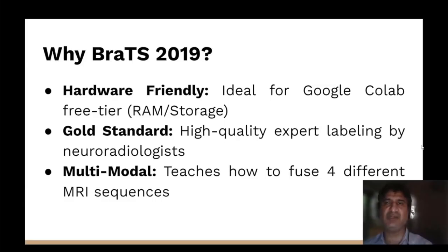The 2019 cohort is much more manageable, featuring only 335 expert labeled scans. We still get to work with all 4 standard MRI sequences, which are T1, T1CE, T2, and FLAIR, giving you the exact same multi-modal experience.